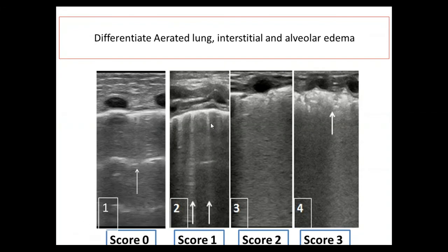And then when you have longitudinal B lines, two or more at least in one single image, give a score of 1. So this is representing interstitial fluid, and typically can be seen after birth in infants with TTN, or later on, for example, if you have preterm infants with PDA, and the PDA causing more interstitial fluid, it also can be seen in that condition.